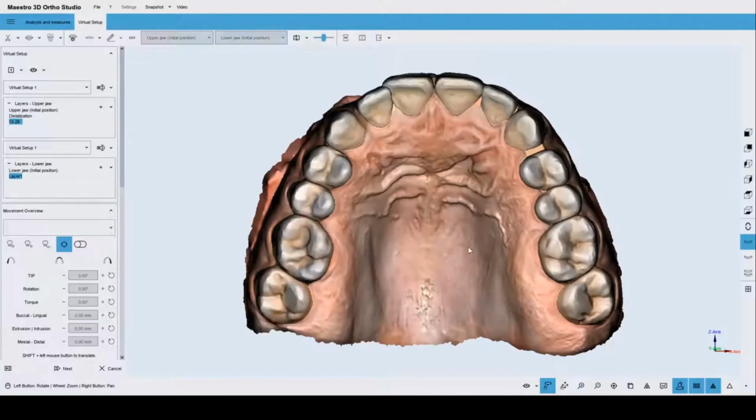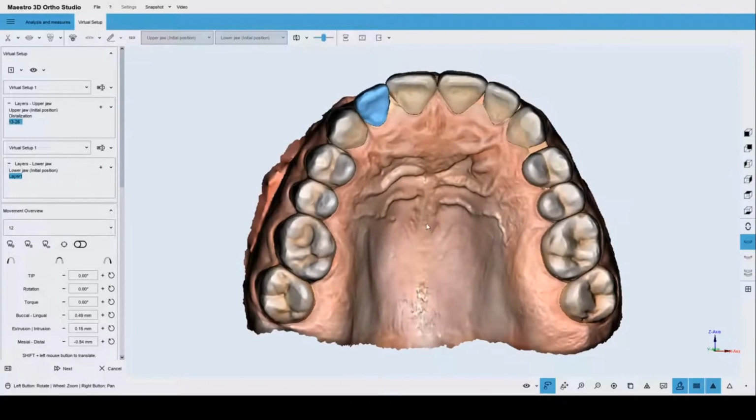I mean, I can use a combination of 3 different kinds of movement. I can start with the manipulator. If I want, then I can perform another kind of movement using the keyboard. Finally, I can refine the movement using the mouse. So the software is very flexible from this point of view.